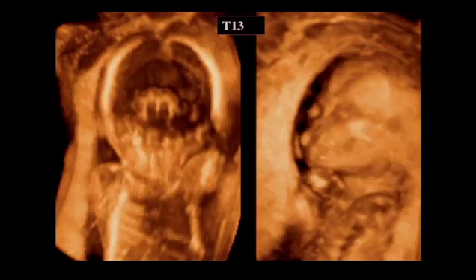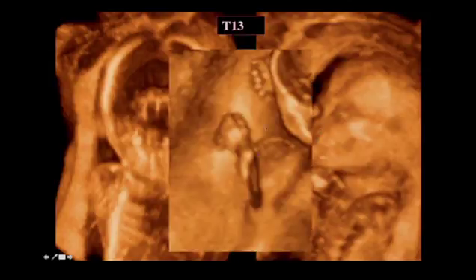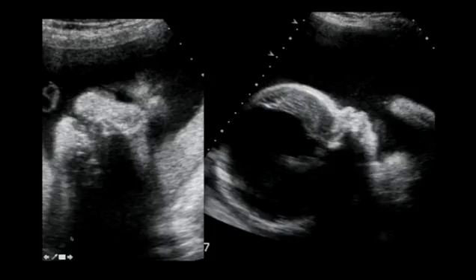This, on the other hand, is a fetus with trisomy 13, and you can tell that there is a large monoventricle in the center here with fused thalami, which is typical of holoprosencephaly. And if you look at the face, you'll find this big old central cleft with a big hole, no nose really, and the eyes are quite close together. But if you look at the hands, and this is the feature that will nail the diagnosis, this is the polydactyly on both hands, and that's what I mean by a sentinel feature.